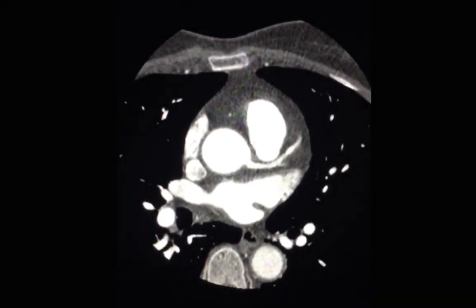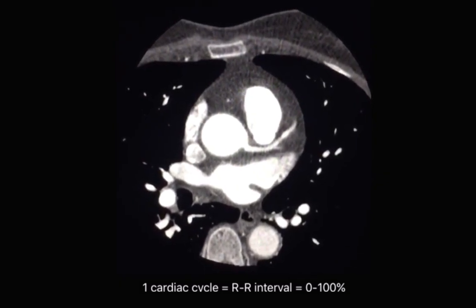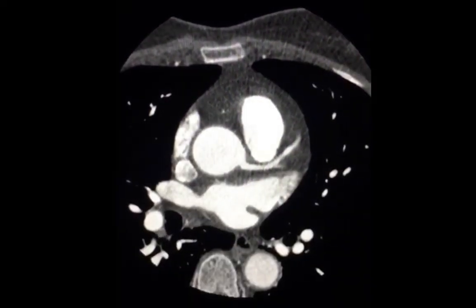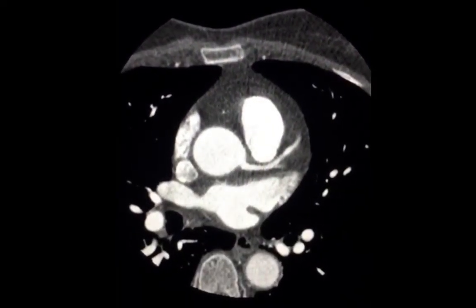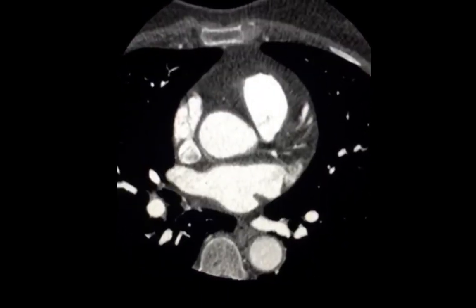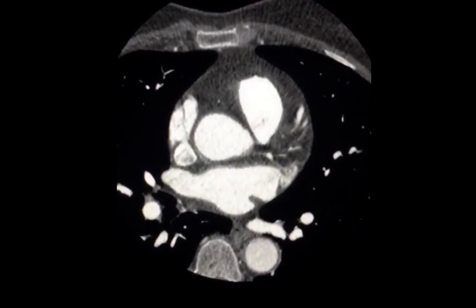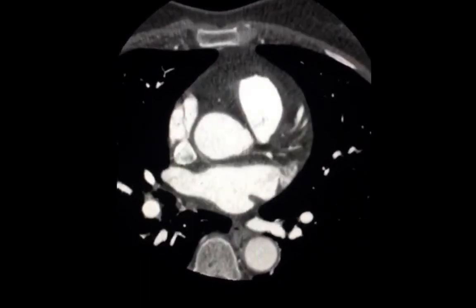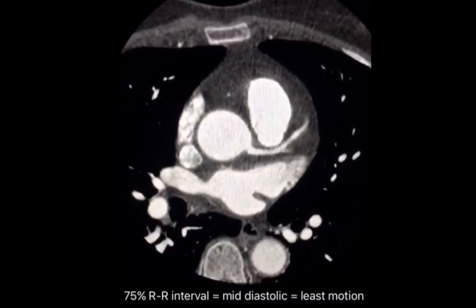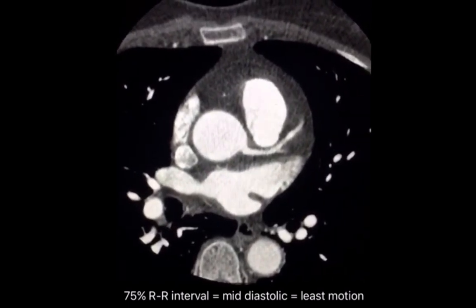And the common language we use in cardiac imaging is to divide the R to R interval from 0 to 100%. It makes sense to expect that the phase of least cardiac motion is the diastolic phase. In particular, the mid-diastolic phase is actually the phase of least cardiac motion where you could see the coronary arteries without haziness. This mid-diastolic phase corresponds to 75% of the R to R interval.